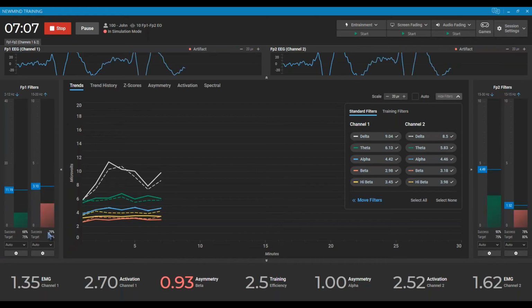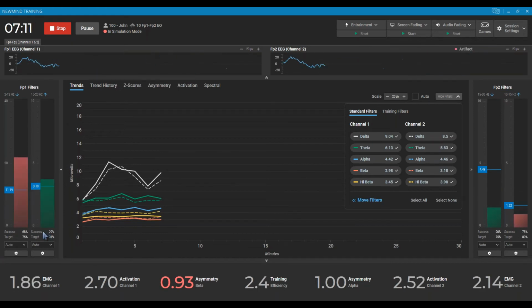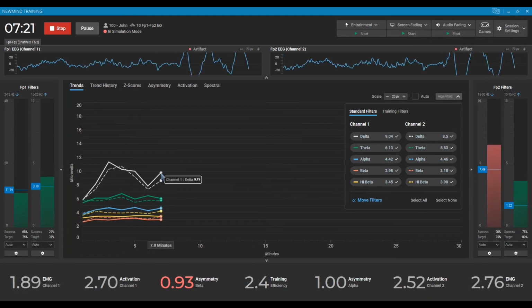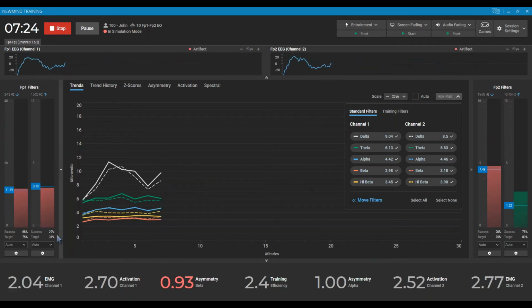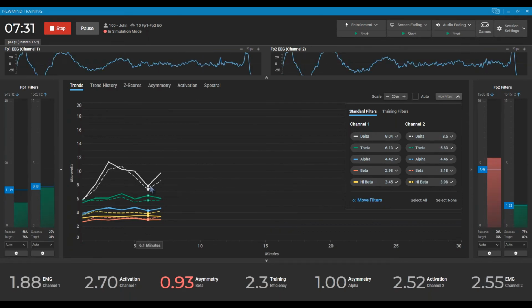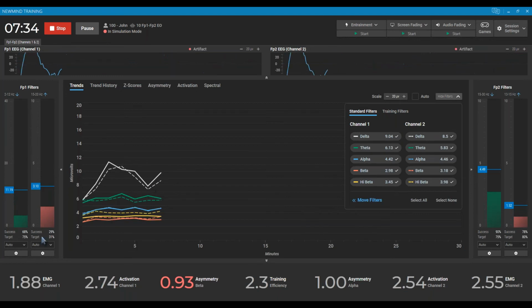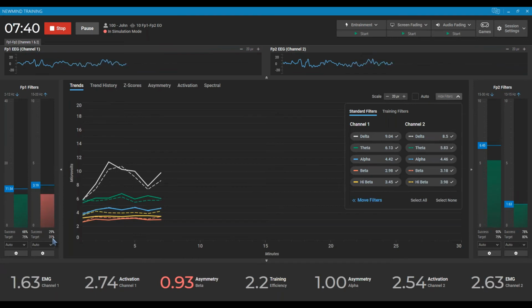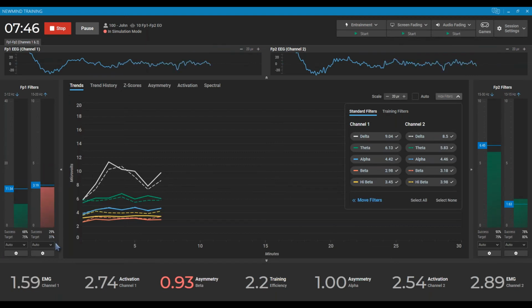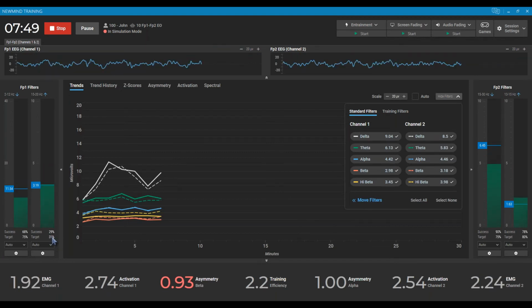So when I was adjusting target percentages in BioExplorer, I had to just watch trend lines. If I made an adjustment, made it easier, made it harder, did my trend line start moving more in the direction that I wanted it to go? With the NewMind software now, you can see I moved this target percentage to just a ridiculously low percentage. You would never want to train somebody down here at 31%, but you can see, because I dropped that down so low, how the success percentage has just plummeted. We only have 29% success rate.